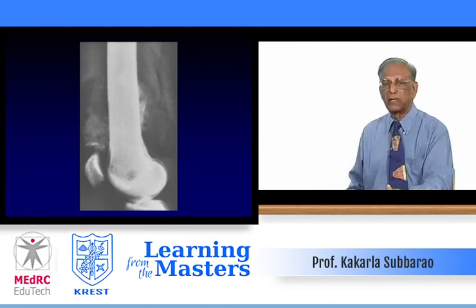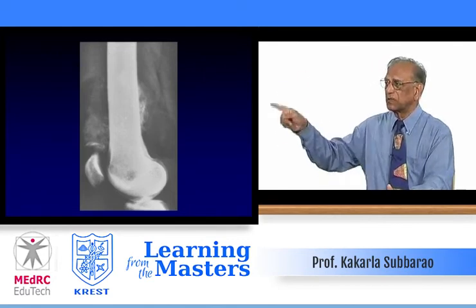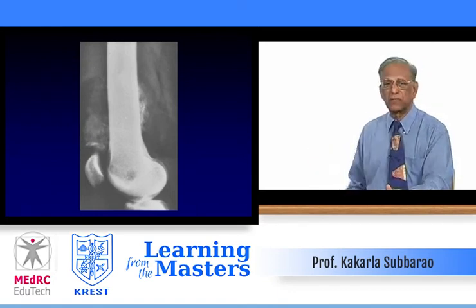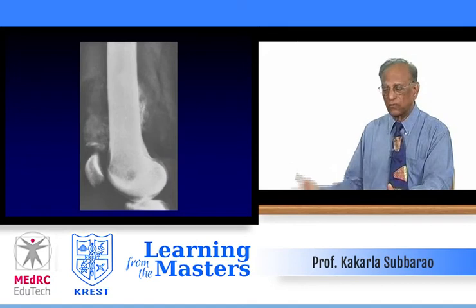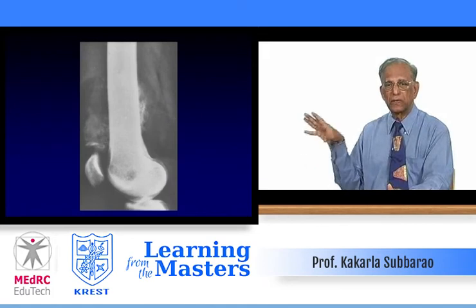This shows much better, a lateral view, focused. Look at the rounded lucency as if there is a lipoma. But then what are these hyperostosis and calcific densities doing? So if you correlate both radiological features, lipomatous tissue, calcifications, ossifications, and the bone is not that much involved.